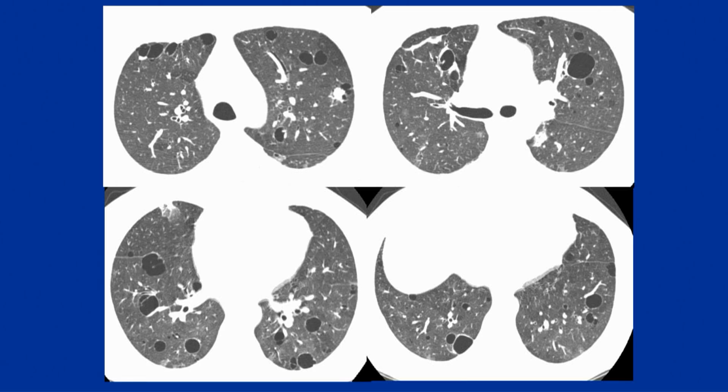And this is the most common manifestation that I see in patients with Sjogren syndrome. It's actually a cystic lung disease. So you see these cysts, which are basal predominant, parabronchovascular and subpleural in distribution. I'll be giving you guys a cystic lung disease talk, I think either the next block of sessions or sessions after that. So I'm not going to go into too much detail here. But bottom line, this is the most common pattern that I tend to see.